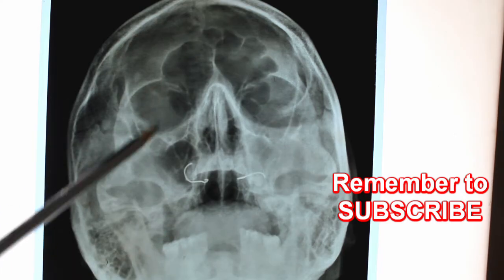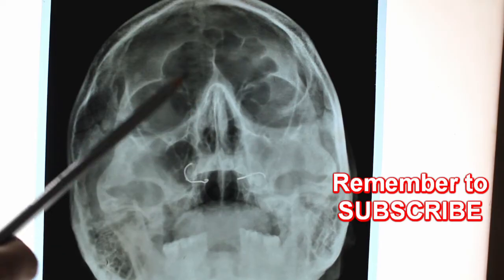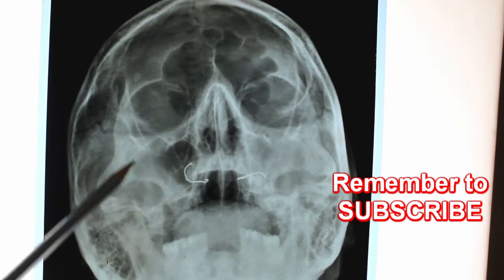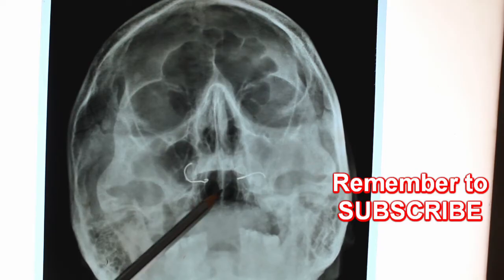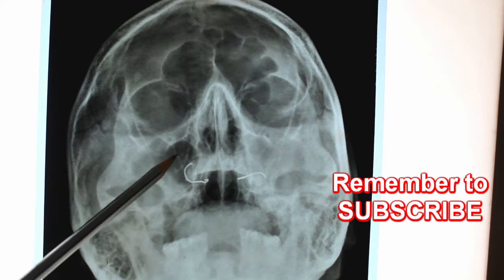In an X-ray paranasal sinus, start with the orbital shadow and the nasal shadow, and above that you will get the frontal sinus, and on the side, on the cheek, you will get the maxillary sinus, and if it is an open mouth, you can also see the sphenoid sinus. See, these are the sphenoid sinus with the sphenoidal septum, very clearly seen.